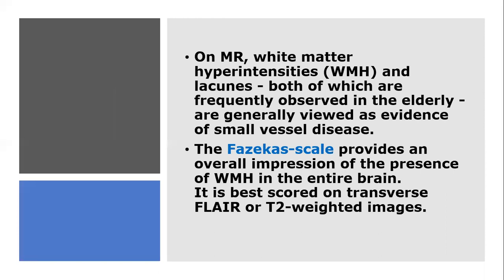On MR, white matter hyperintensities and lacunes, both of which are frequently observed in the elderly, are generally viewed as evidence of small vessel disease. The Fazekas scale provides an overall impression of the presence of white matter lesions in the entire brain. It is best scored on transverse FLAIR or T2 weighted images.